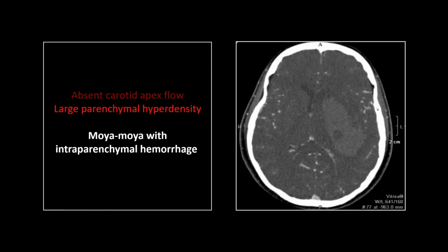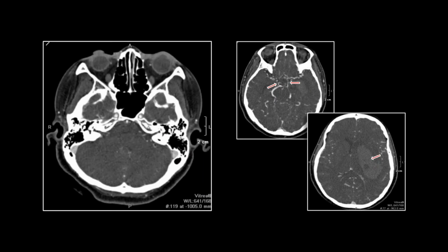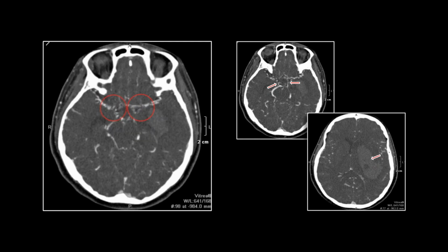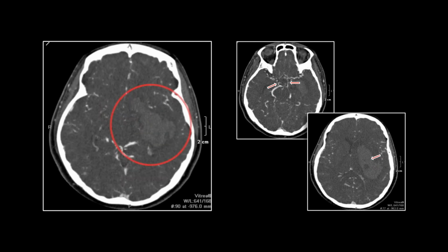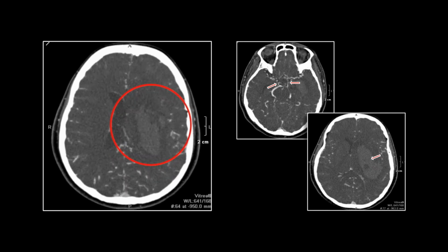This patient, obviously, you have to gather up a huge head of steam to push that blood through all those numerous tiny narrow vessels. And so it's not surprising that this patient ultimately presented with a hypertensive bleed. And there that is. So let's look at the carotid though. Follow that carotid artery up and it kind of vanishes and you see nothing but tiny little wispy vessels all reconstituting the more normal cerebral vasculature. And there, of course, is that acute hemorrhage.